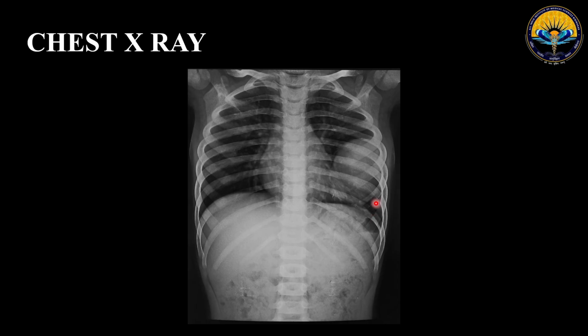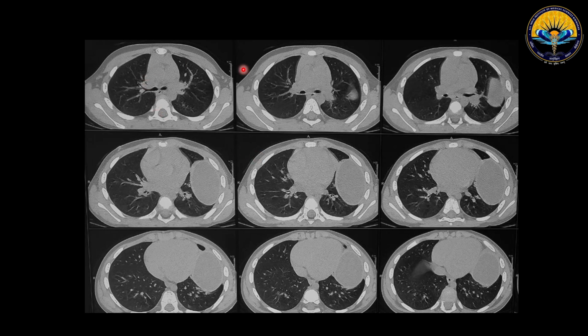So the child underwent CT scan for the same. These are the selected axial cut sections of lung parenchymal windows showing a rounded oval fluid attenuation lesion with a thin, smooth, hyperintense wall. It is abutting the left lateral chest wall. There is no evidence of communication with the bronchial cavity, no air fluid level, no fat or calcified component of the lesion.